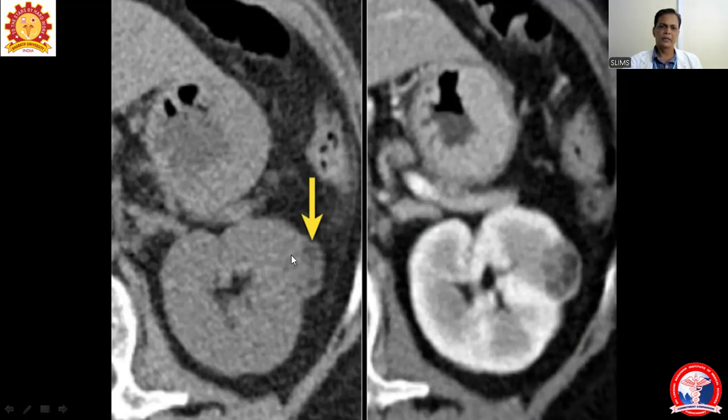along the lateral margin of the kidney, there is an abnormal lesion seen. Both the images show the abnormal lesion. So that is characterized. Angiomyolipoma is benign, but why is it important? Because to rule out that it is angiomyolipoma, to come to the diagnosis, so that it is not a malignancy. It is not a cancer. It is important to diagnose it if it is angiomyolipoma.